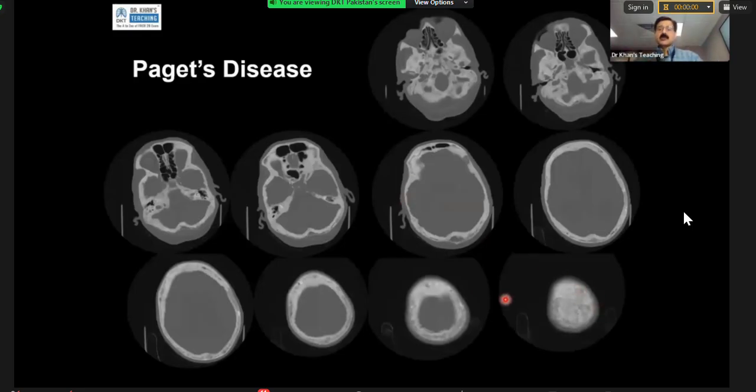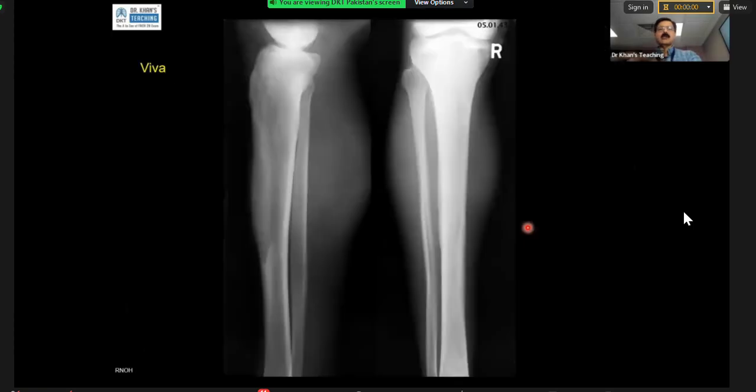Another case which can come in the exam, and when you do a bone window, only then can the examiner show you some finding, and Paget's disease can be an incidental finding. And when you say that you want to do a brain CT, or in your usual practice, you check it on a bone window, you might find this. I just wanted to show you a gross case of Paget's disease. Whole of the calvarium is involved. Over to you, candidate 6.